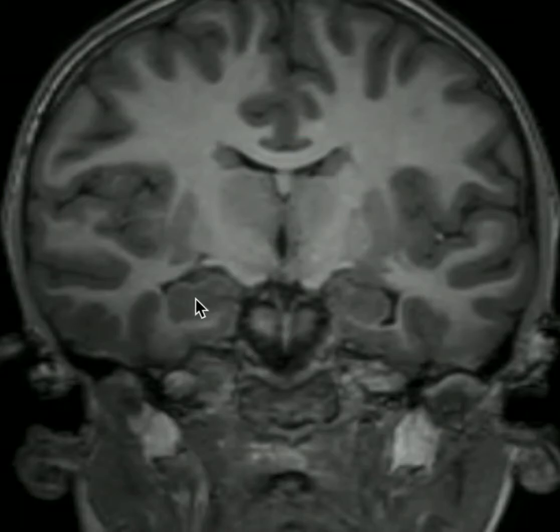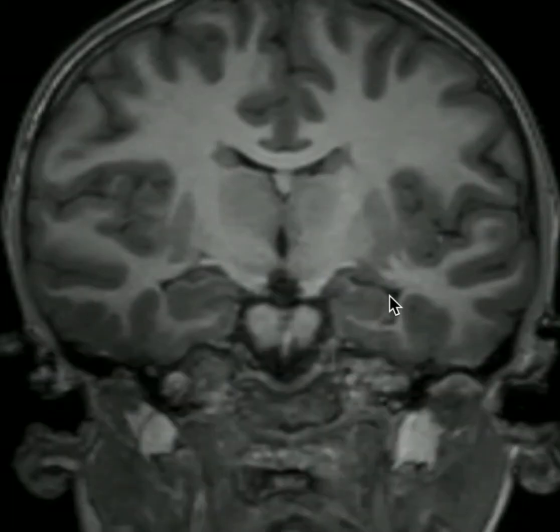Here on this slice, we're seeing our right hippocampal head, and over here, our left hippocampal head. We're also looking at the anteriormost aspect of the temporal horn of the lateral ventricle right here, and we see a little medial extension off of it, better seen if I go back one slice right here. This medial extension off the temporal horn of the lateral ventricle is known as the uncal recess. The uncal recess will separate the amygdala above from the hippocampal head below.